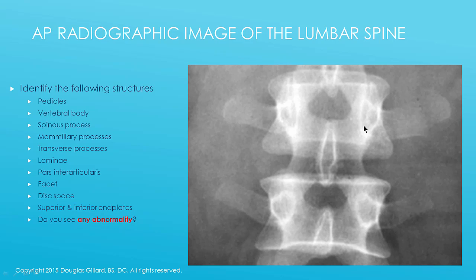How can you say this? An X-ray, the harder the bone, the more white. It's called hyperintensity. The more hyperintense something is, the harder the bone is. So let's start here. These are the pedicles. They absorbed a lot of the radiation to make this look white. And then in here, because we have a space between the lamina, it's not a hole completely.